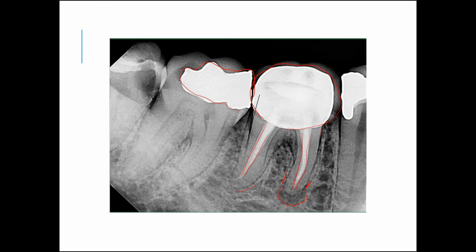Now, considering 38, we can see radiolucency on the mesial aspect of 38, which is an ill-defined radiolucency suggestive of dental caries. And in 35, we can see well-defined radio-opacity suggestive of restoration. Now, while postulating the radiographic diagnosis, first we will give the diagnosis for the tooth of interest, that is rarefying osteitis in relation to 36, then restoration seen in relation to 37 and 35, and a dentinal caries seen on the mesial aspect of 38.